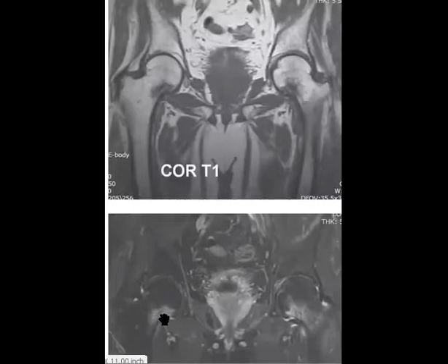The characteristic location: you will ask in the history about steroid therapy, steroid use, right? Maybe. So insufficiency fracture, as you mentioned, Nermine and Doc, and I see, it would be nice, the top of the differential in this case. And in the X-ray, maybe you can find some osteopenia, or maybe you cannot find anything, right?